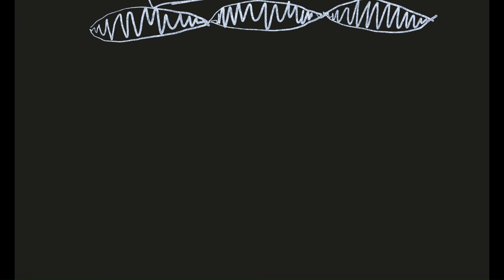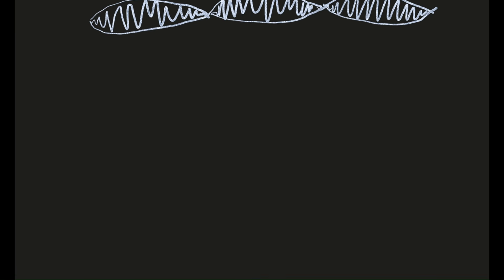So that was all about the basics of ECG for interns and house officers. There's one bonus point I would really like to remind you all. This is the ECG I got in one of my exams. So when I saw the ECG, let me give you one point over here.